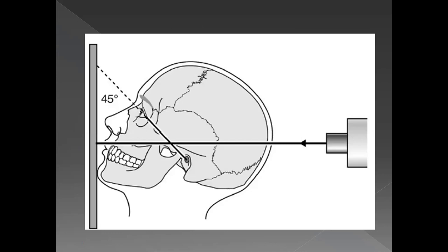So how is this X-ray taken? I know it is called a 0-degree view, but here you will note that this 0-degree is basically sort of a misnomer in a way, because you can see that the patient has tilted their face upwards. And how much of a tilt are we looking for? Basically, this tilt, if you can see this line over here, this canto-meatal line, because it's made up from the lateral canthus all the way to your external auditory meatus.